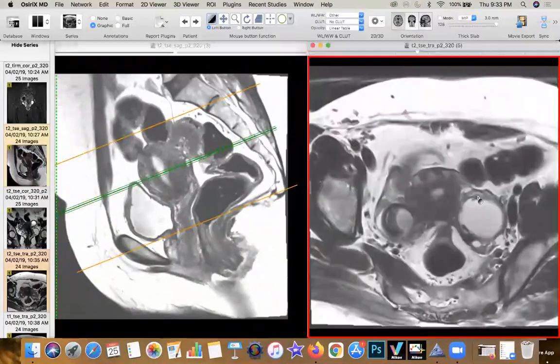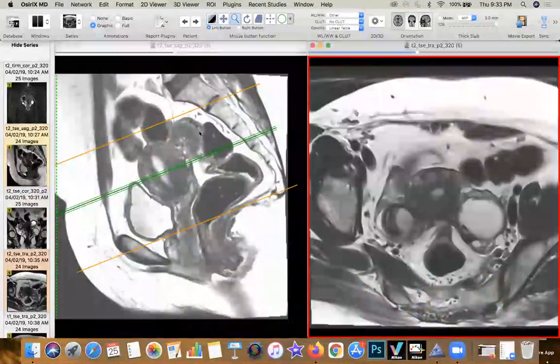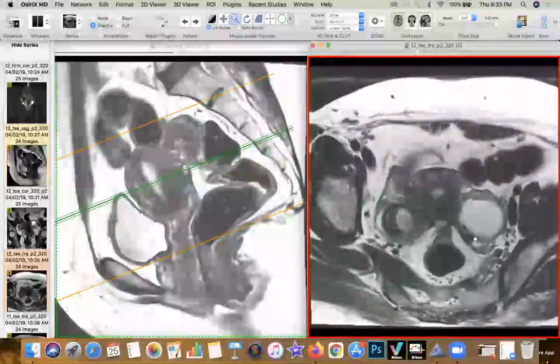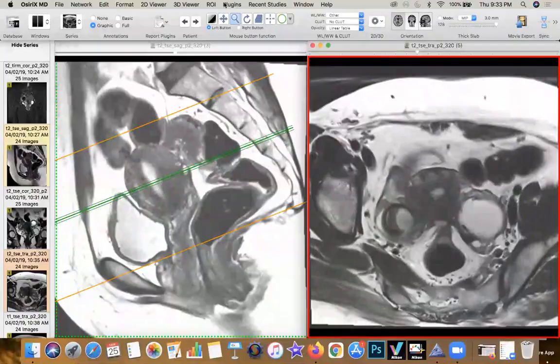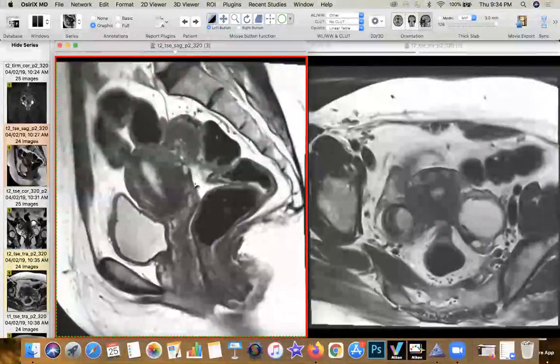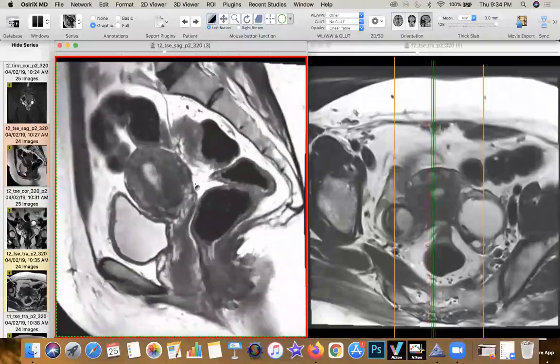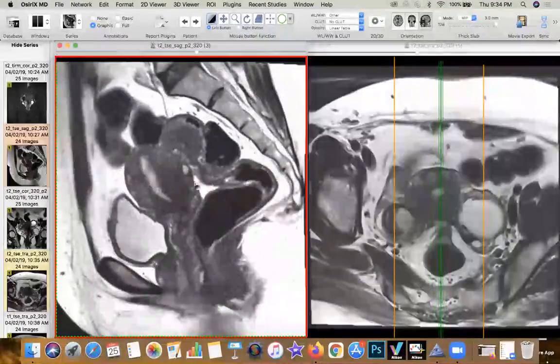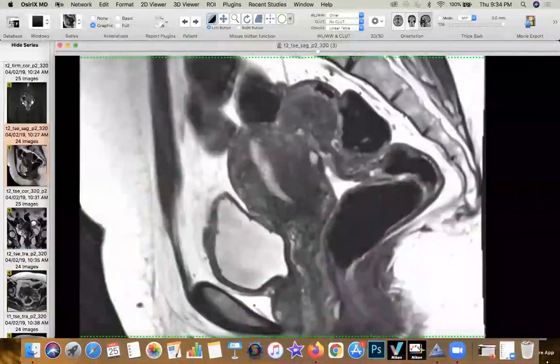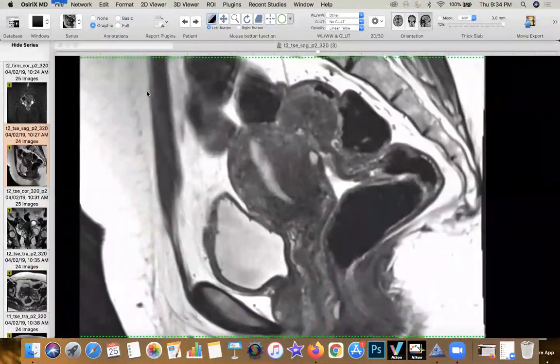So now what we had was, in a young lady, a rectal lesion with bilateral adnexal lesions along with extensive tethering and fibrosis, which has caused what we call the typical frozen pelvis appearance imaging on the MR scan. Now let's try to decipher how this looks on the T2 weighted image. So I'm going to go back, I'm going to do this case again in detail, and then I'll run through with the remaining cases.